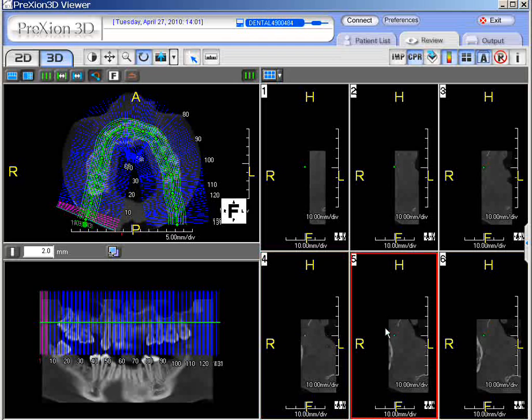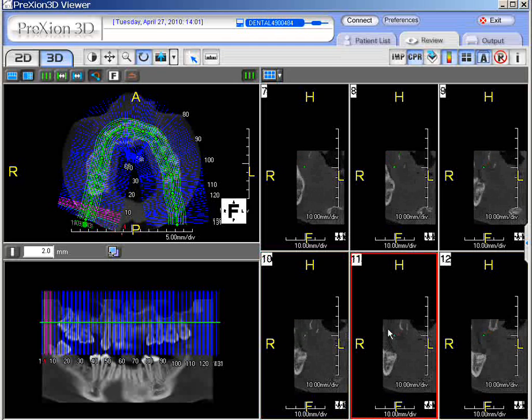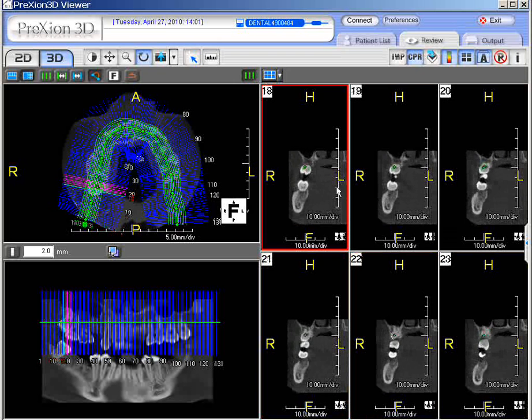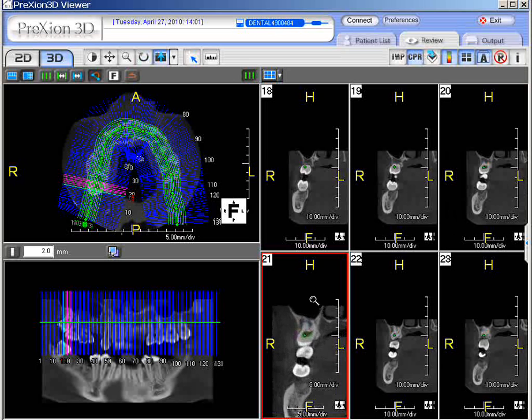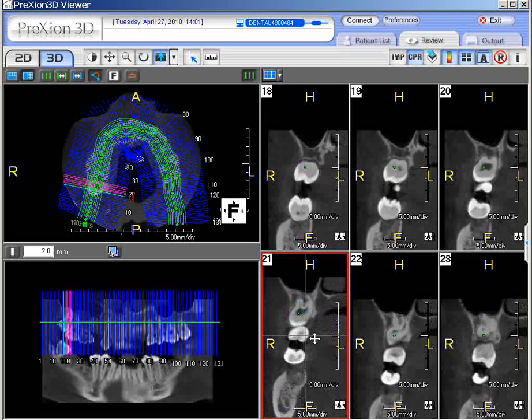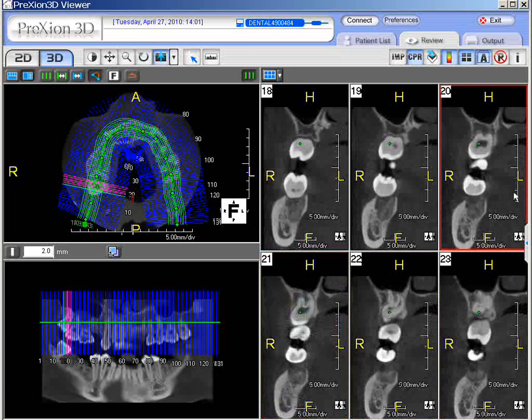It doesn't really matter which one you select. And by scrolling up very gently, we can see that these frames now correspond to what's selected here. Okay, now to make these images larger, on this side we can just hold the middle wheel down on the trackball, move the mouse north, release. To recenter, right click, and you can recenter into the position, and that applies to all of the frames.